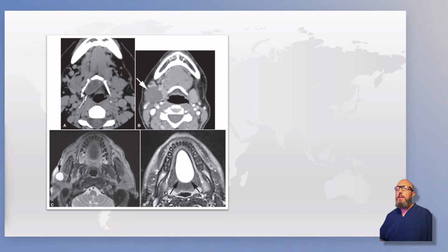What's that one? This is the hyoid bone. Hopefully you can appreciate that as a dentist. You know your anatomy. And it's roughly in the midline, a little bit off center of the midline. But what was the midline one in the neck? Anywhere from the foramen cecum to the thyroid isthmus. That was your thyroglossal duct cyst.